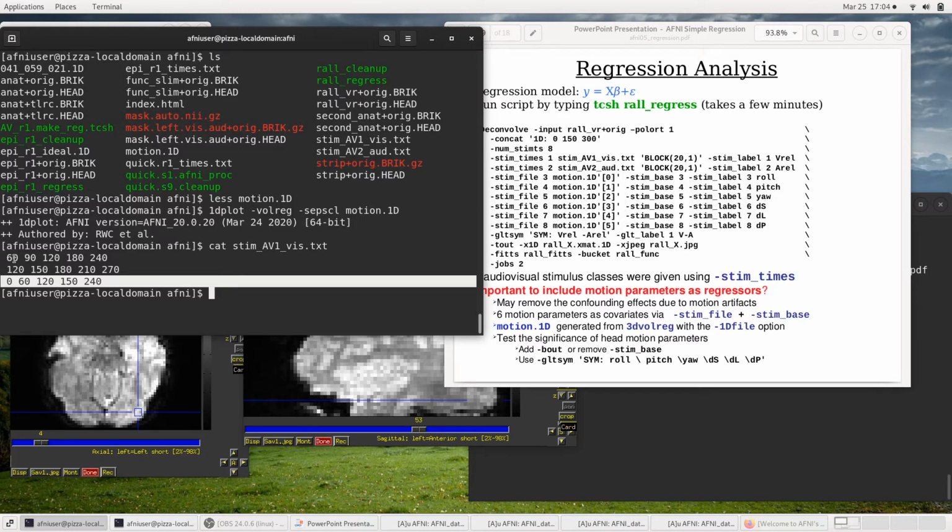In terms of the data that the 3dDeconvolve command knows about, one crucial detail here is that we removed 2 time points from our data. That's to say that from the scanner we removed 4 seconds of data. Now, does the scanner account for dummy volumes? Does it account for that dummy time or the pre-steady state time automatically? When does the presentation software start? During the pre-steady state time or after it?